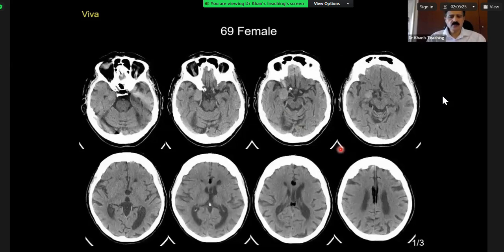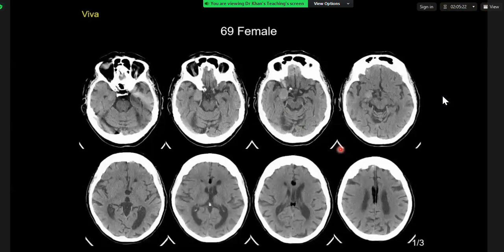Over to you. Okay, so these are selected unenhanced CT images of the brain for a 69-year-old female. There are 2 striking abnormalities, one being a midline low-density lesion, which could be of fat or air, presumed to be an interhemispheric lipoma. Another abnormality is seen in the region of the right temporal lobe around the internal carotid artery, where it segments into the middle cerebral artery. It's a rounded, high-density lesion, which appears to have some possible peripheral calcification. I'm not sure if that's just projectional.